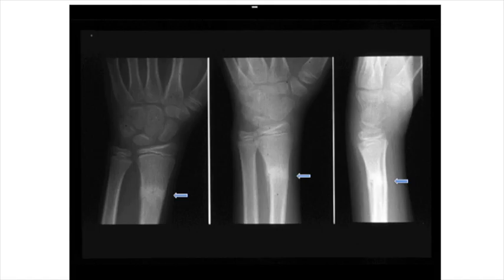So this is a sample of another fracture in a teenage patient. You can also see the processes of callus, hard callus, and remodeling. Okay, so it's very important to know. Remember, in children, the result of this kind of pathology is better, but in adults, you have to follow up with orthopedics always.